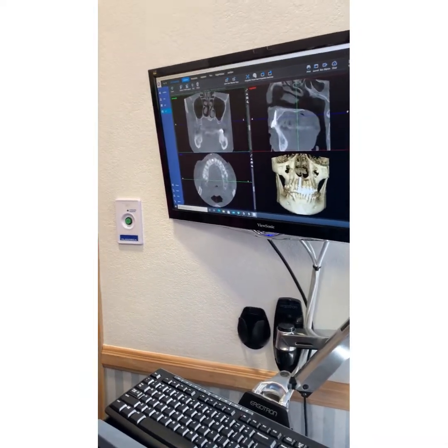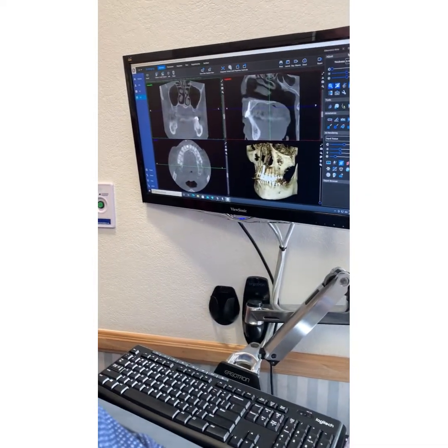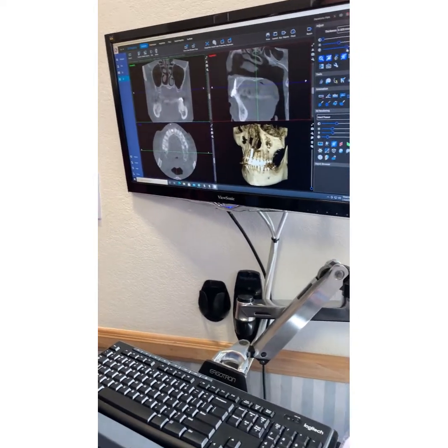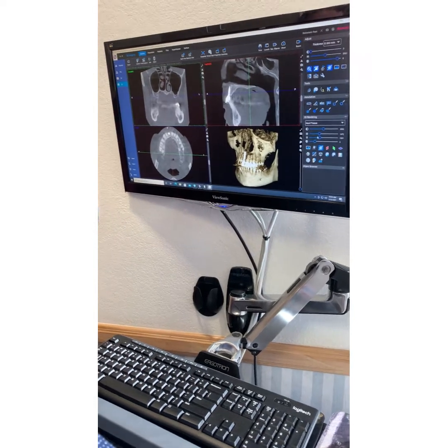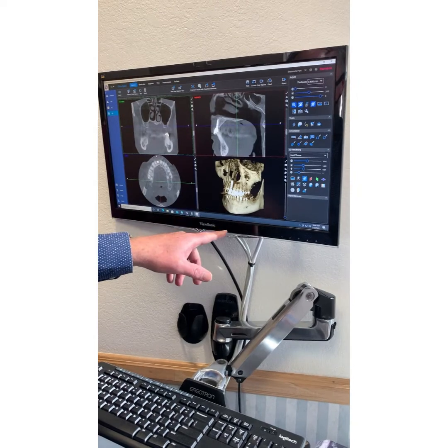Smile, it's Halloween. He likes to study it. So it's just changing the density? Well, these up here will affect your 2D slices. So I generally use the third slider down to sharpen these up a little bit. And then these down here affect your rendering here. So the third slider down here is the threshold. There's some extra noise around here. I can eliminate that by doing this.